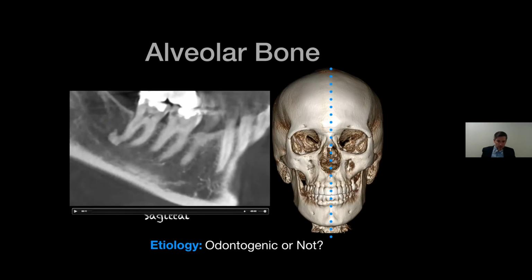This is an example of what's called a dense bone island. A dense bone island is just a little area of really dense bone, like the name would suggest. It's almost like cortical bone or compact bone has developed in the marrow spaces or the trabecular bone.